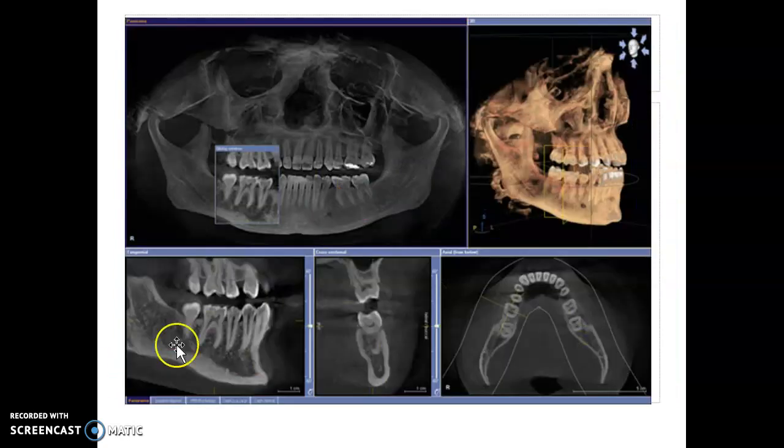Okay. Now, this is just a different view. They've actually limited it to just one of the vertical slices, but you've got your pan. They've clicked on it to zoom in and look at one area. There it is. This is your vertical slice looking at probably just the center. Since these are both molars, that's probably just right down the center of those second molars. Or sorry, that's your first molar. And then this is a horizontal slice, and it's showing you where they're taking that image from. And then this is your 3D reconstructed model here, showing you what those bones look like.